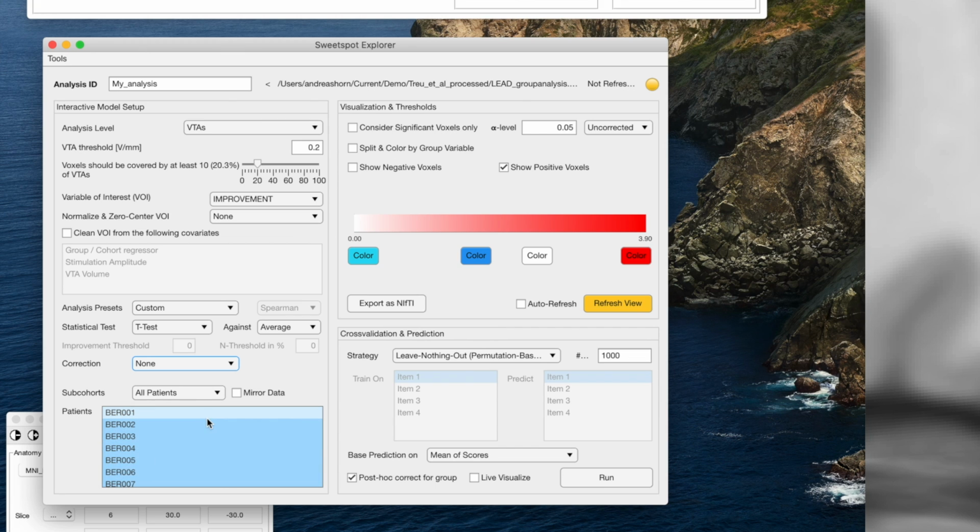Now down here, and that is again something common to all of the 3 tools, you can select which patients go into your analysis, right? And the idea usually here would be to use a training and cross-validation set. Let's assume these first patients. And then we train our model based on that, and we keep that fixed all the time. We can then use cross-validations, and then finally in the end do the test on our holdout set, right? So this latter part of the data set could be our holdout set that we don't touch until the very end.